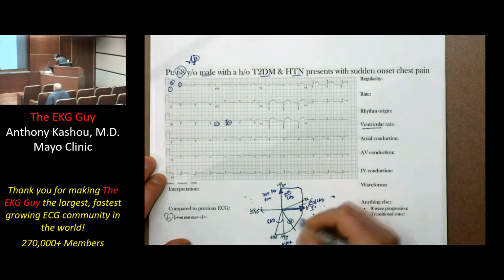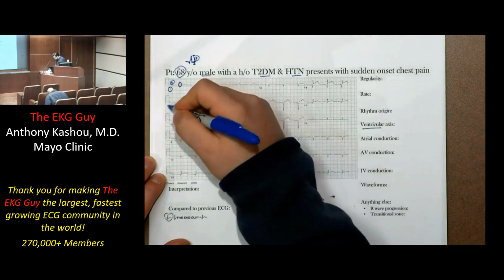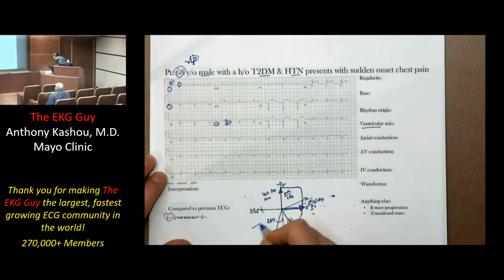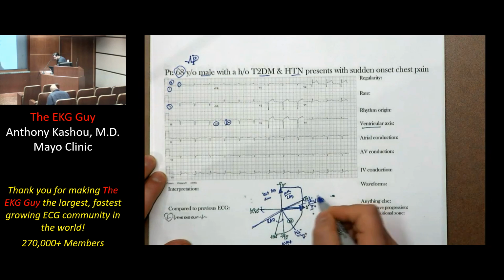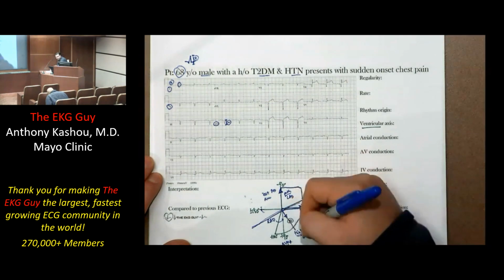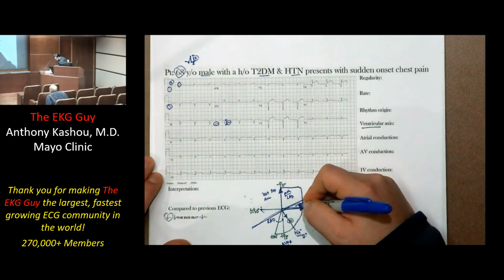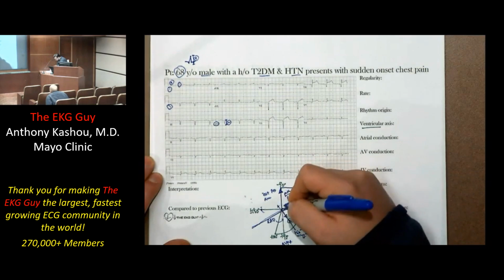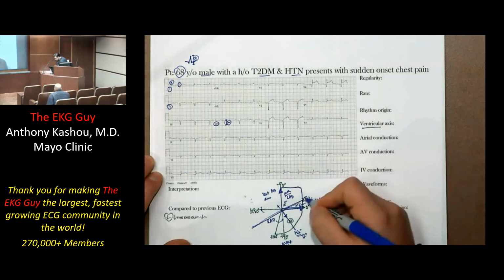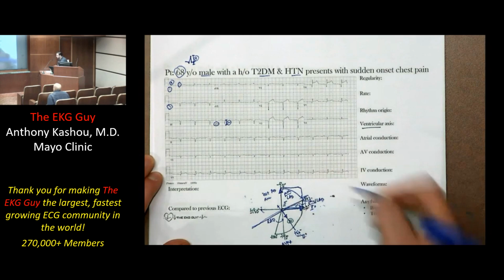Lead 2 comes here, as we mentioned, at positive 60 degrees. So this is where lead 2 is, and it also sits here. And we look at it. If it's mostly positive, so again, 60 is here at lead 2. Perpendicular to lead 2, which is convenient, is this line here, which is that negative 30 degrees. Meaning that if it's positive in lead 2, we head towards it, and we'll be in this region here. If it's negative, we'll go in this direction and we'll be in this pathologic region. So we're trying to figure out, are we in this region here or this region there?